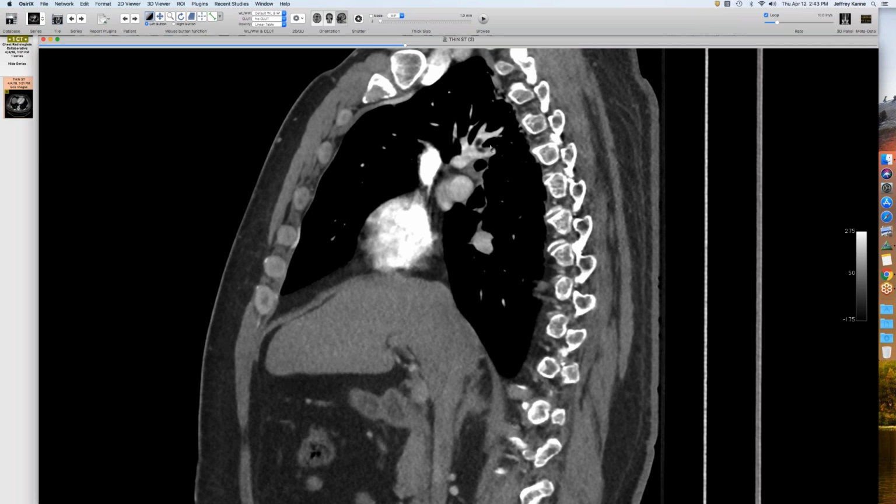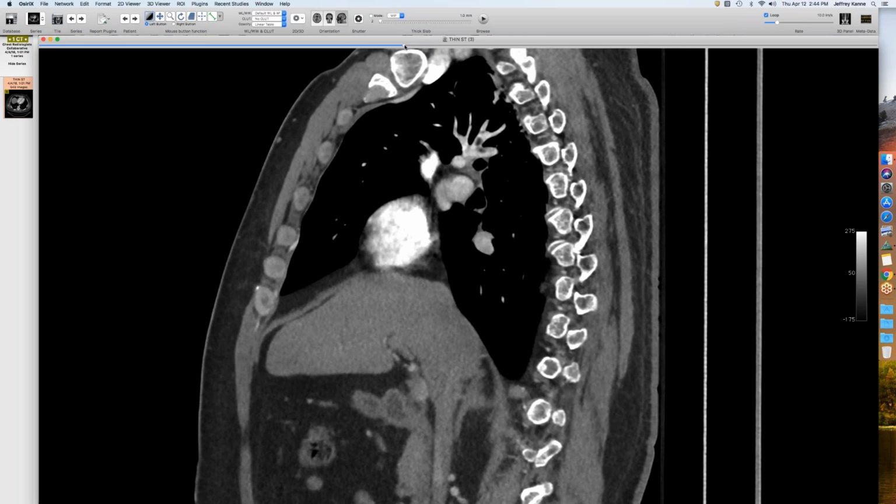So it's a fat embolus, I suppose, but I just can't wrap my head around where this gigantic blob of fat came from, given it was a calcaneal fracture and a Schatzker 1 tibial plateau fracture. There wasn't a huge vascular injury. And with fat embolism, we think of micro droplets getting somehow into the capillaries or the venules that then make their way back to the lung. But this would have to be a sizable vessel. Have you guys ever seen a true fat embolus?